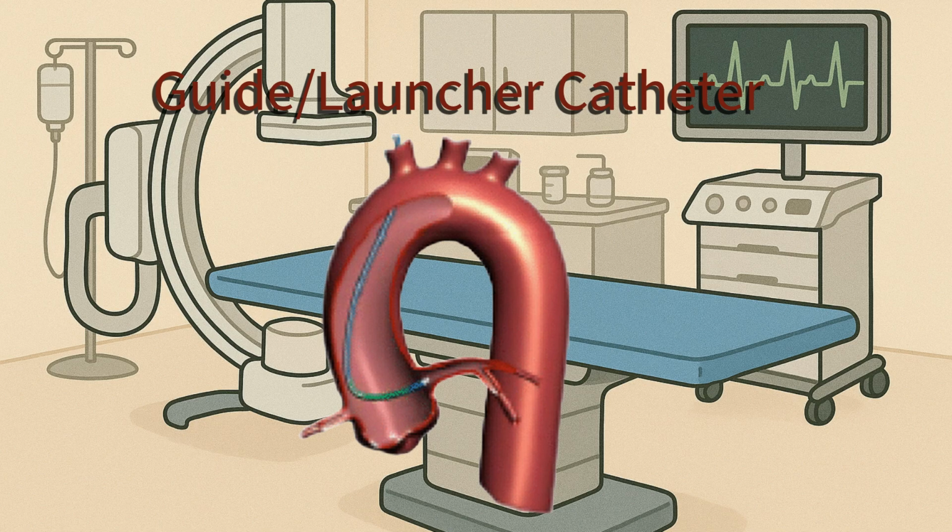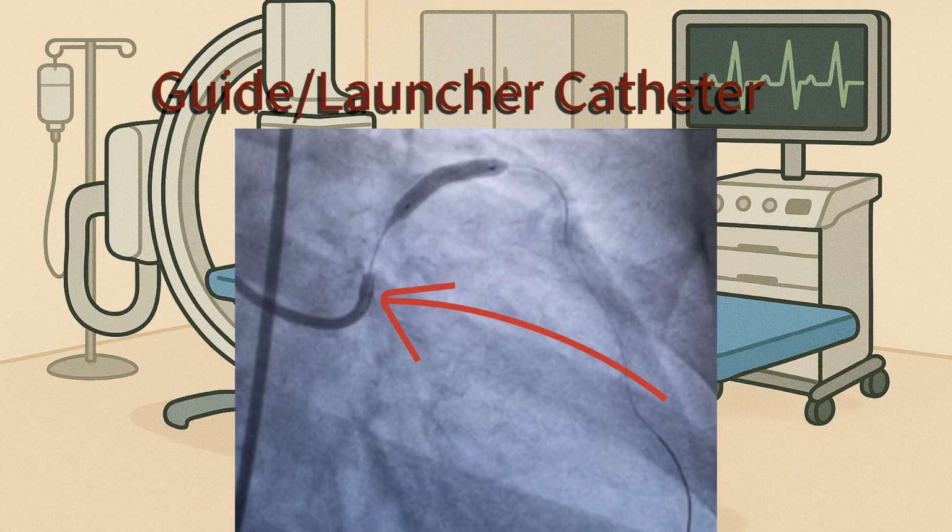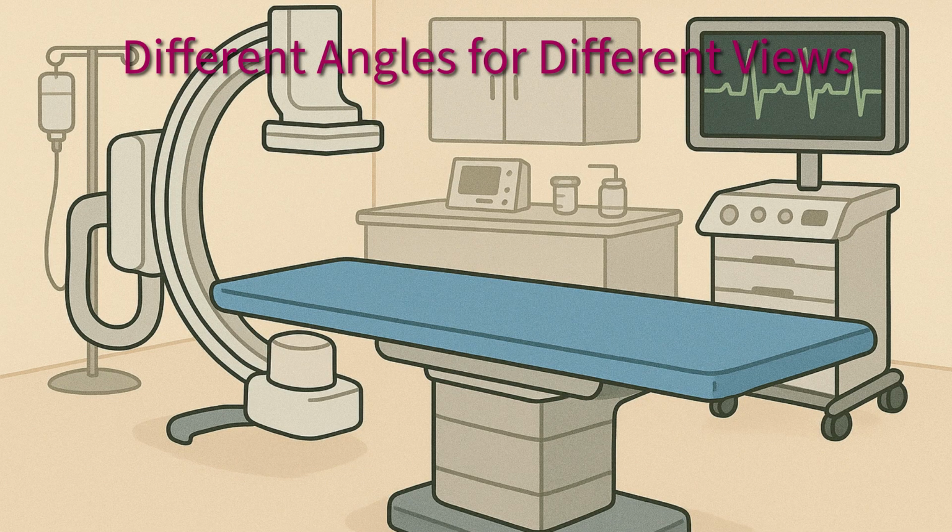The whole point of a guiding catheter is to engage and hold that spot so you can put down your wires, you can put down your penumbra, you can put down your stent, you can put down your balloon. Everything goes through the pathway that is the launcher, over the wire, into the vessel. The launcher is much more sturdy, so you can put all of this equipment in and not puncture through your guide catheter.